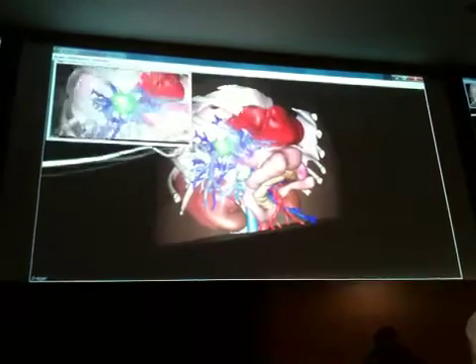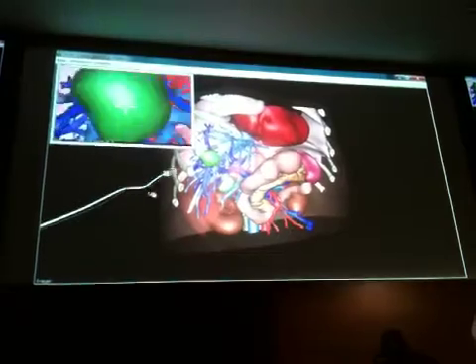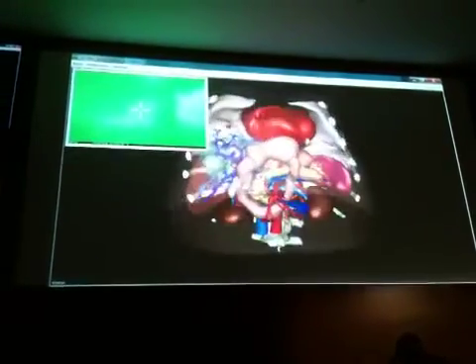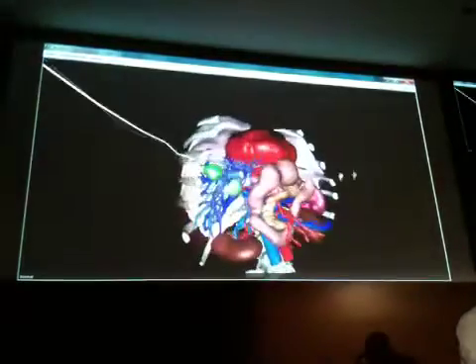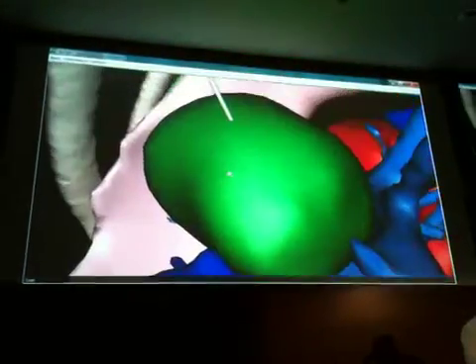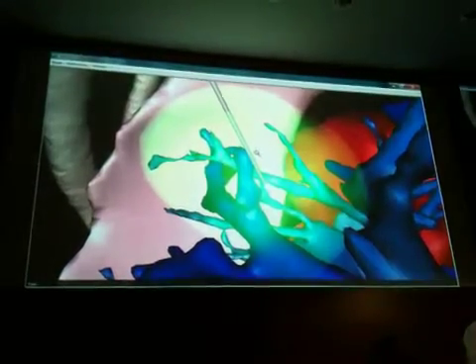Performed, and now I can put it inside really easily, as you see, in order to position the needle perfectly inside the tumors. I can verify the location from several aspects. I can also remove, as previously, any structure that prevents me from having a good vision. I can go inside the liver to see the tumor in a close view. I can put my tumor under transparency to see the position of the needle precisely.